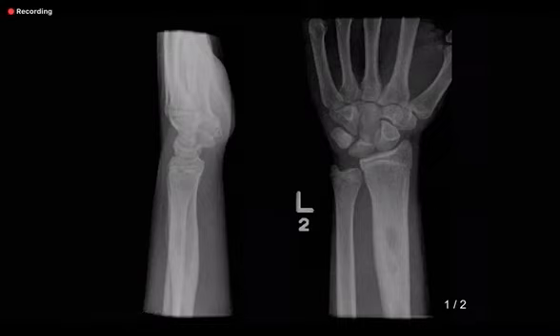You used the correct term, an aggressive lesion, with a differential of tumor versus infection, and then asked for an MR. One debating point is your differential on the plain film, Ewing's versus osteosarcoma. So osteosarcoma versus Ewing's, where are you?